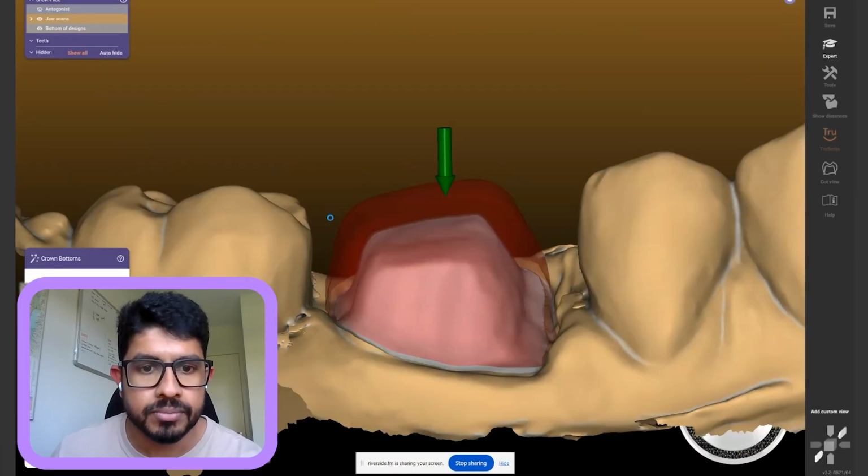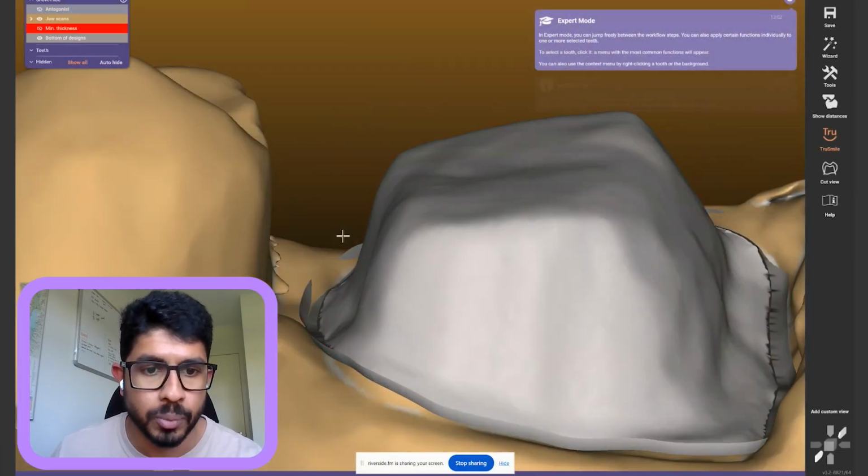What do you do if you've sent the scan and it's like, oh, I've got a tissue tag over here, and the patient's not coming back? So what options do I have? If you are experienced with understanding, again, a color model helps with that, by the way. With a color model, I can see exactly where that tissue tag stops, and I can actually physically edit things if I want. It's not the ideal thing to do, and I don't always recommend this.